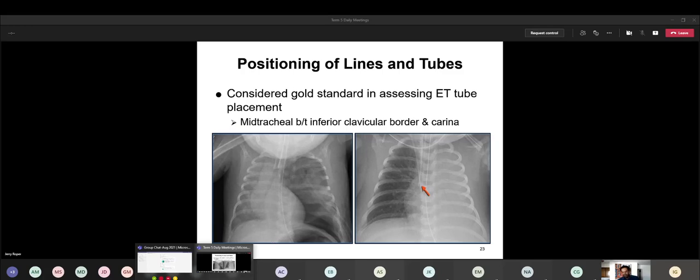So here we have the tip of the ET tube. This is the radiopaque line. And this is the other border of the ET tube that happened to show up as well. But this for sure is the radiopaque line because it's more white than the border of the ET tube. And then this right here is also the ET tube, the part that's hanging out of the mouth that's going into the patient's airway. So then it goes and it curves inward this way.